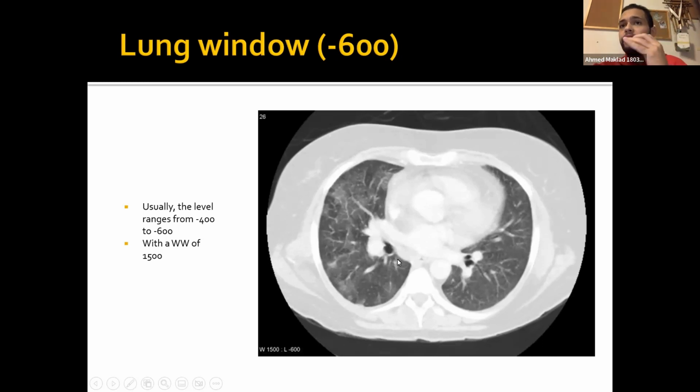So the lung would appear uniform in color in the lung window, all right? And to detect any abnormalities, right? And let's say those abnormalities are very subtle, they're small. If you want to really see them, you're gonna have to set it to a lung window, because in lung window, everything else that does not have to do anything with the lung is eliminated, all right? So nothing is really distorting the view anymore. It's just the lung and whatever is happening inside of it, all right?